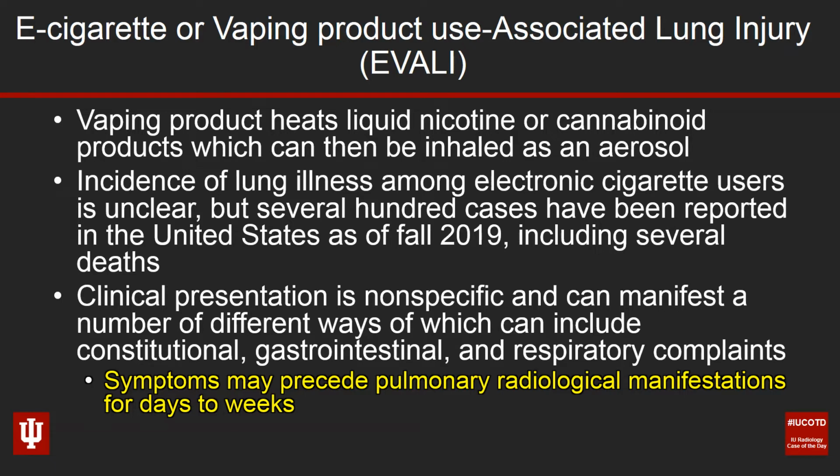This is Sarah Lay taking over, and this indeed is a case of e-cigarette or vaping related or associated lung injury. We see this obviously with vaping related products with nicotine or cannabinoid products superimposed. I can say that more often than not in the cases that we're starting to see, these have been cannabinoid related. The incidence of e-cigarette users and how often this happens is quite unclear at this point.